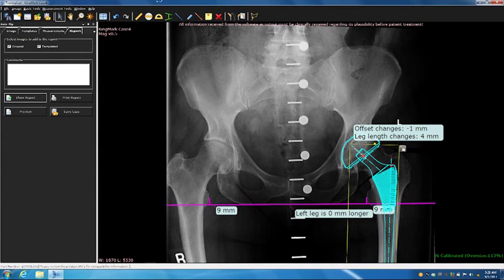So I apologize if I rush through things as we go, but we're here for deformity, not for hip templating. But this at least gets us used to clicking and moving around the program before we start talking about some of the new words and slogans while Sean brings up his stuff. Questions about anything relating to anything I've showed you so far?